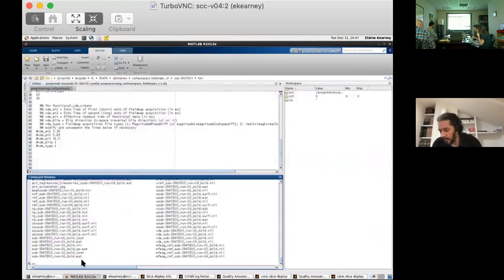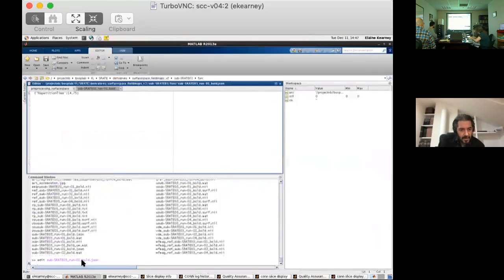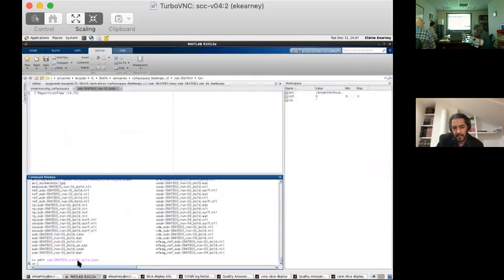I'm trying to look at whether there's going to be one information field that is called something like phase encoding direction. I want to look at whether it says J plus or J minus. So just edit it. Yeah, just edit it. No, it doesn't have anything. Too bad. Perhaps in the field map acquisition, instead of the functional acquisition, we'll have more information. Yeah, good point.